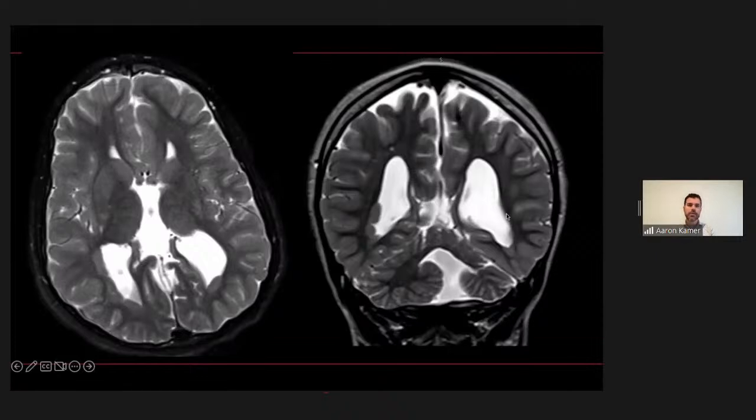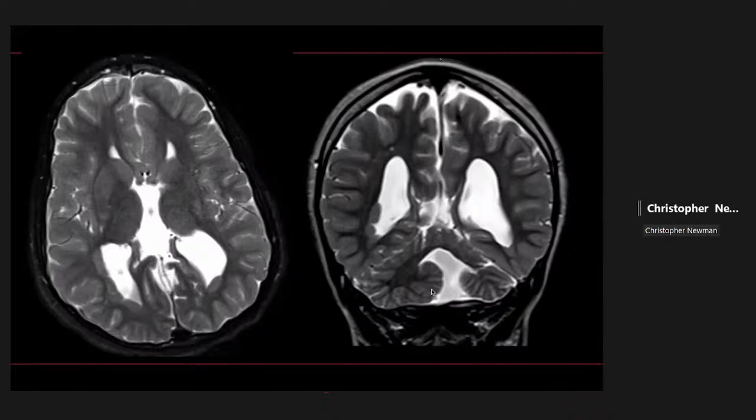I'm going to ask, let's see, Chris, can you talk about this case? Yes, we've got, looks like axial and coronal T2s. Let's see, I want to say we've got absence of the corpus callosum here, a little colpocephaly. So there's already some maldevelopment issues going on. Yeah, definitely. And then definitely something happening with the cerebellum, like a cleft there. I don't know. This would be probably not Dandy Walker, but maybe in like a Blake's pouch spectrum. Let's not talk about that right now. Yeah, that sounds like Pete stuff. Fair.